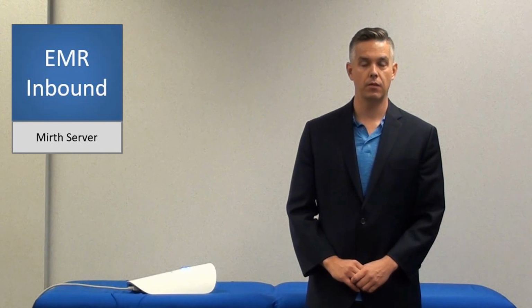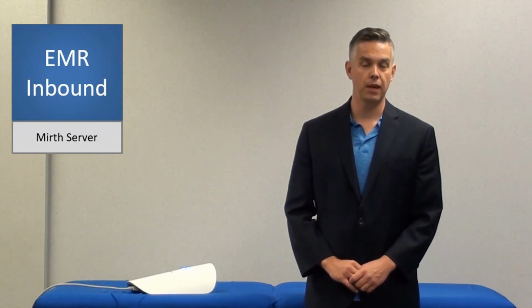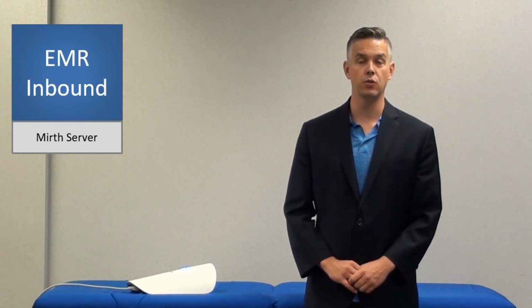To enter data into the PADnet system, there's a number of different ways you can get patient data populated to begin a test. One way is to leverage your EMR, and we can support connecting our PADnet system with your EMR through an HL7 interface. We can gather data from an EMR in a number of different ways, and that is an optional module.